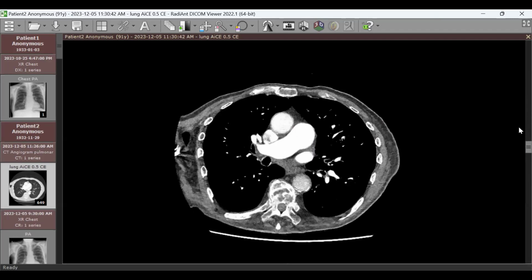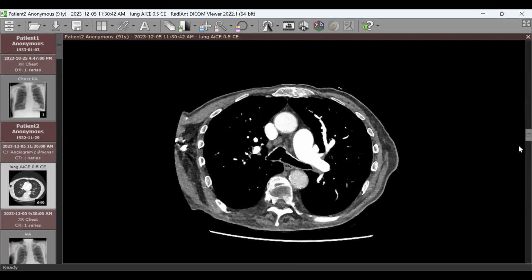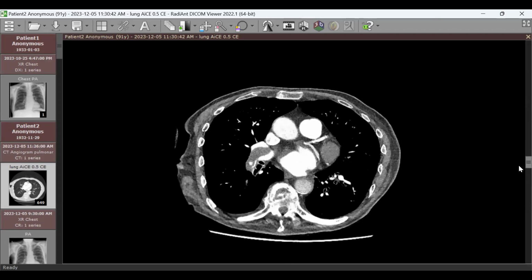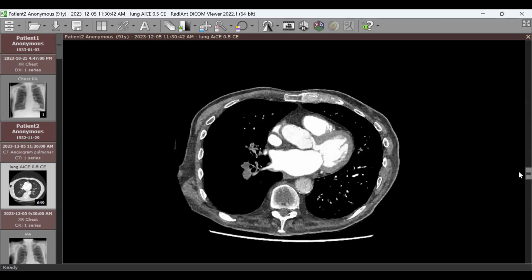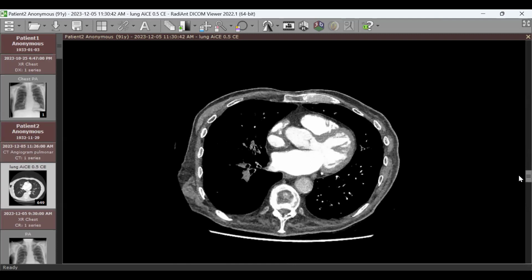This is the upper. Can you see it? There is no filling defect in the upper lobe artery. So this is the main artery, starting from here and going downward, and then more downward. Involving both the middle lobe arteries and the lower lobe arteries, right? Yeah. And causing expansion of the lower lobe arteries. That's right. That's what we saw on the chest X-ray.